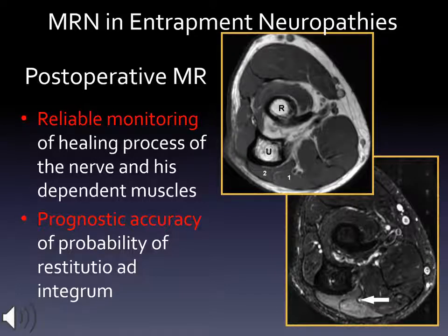Morphologic MRI can help in the differentiation of the muscle denervation stage. In the acute and subacute phases of peripheral nerve injury, involved muscles show high signal intensity with fluid-sensitive sequences. In the chronic stage, there is fatty infiltration, which characteristically appears as areas of high signal intensity on T1 weighted images, and muscle atrophy. Muscular denervation changes identified at MRI can be carefully evaluated together with clinical and electrophysiologic changes during follow-up, as they all have an effect on patient outcome.